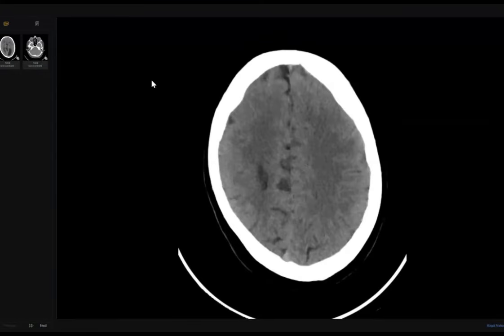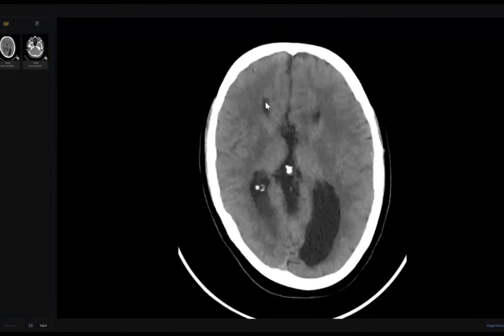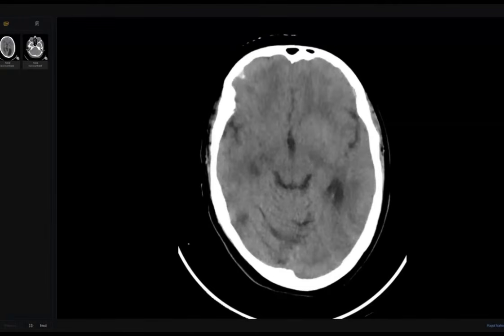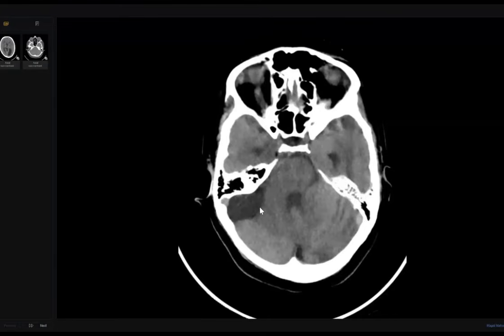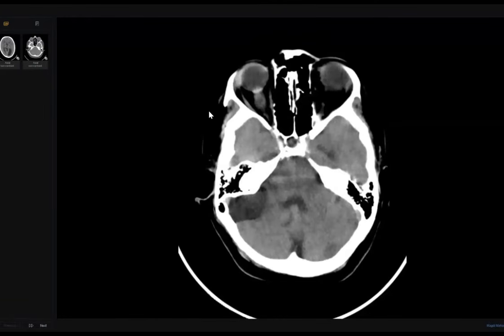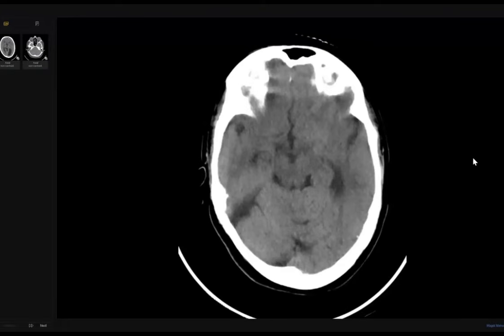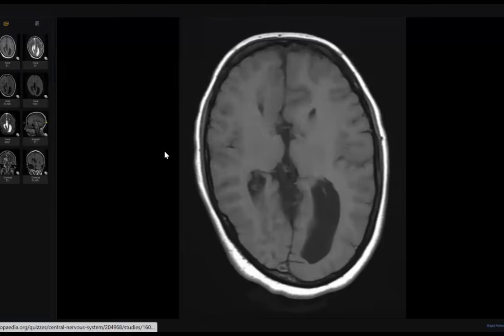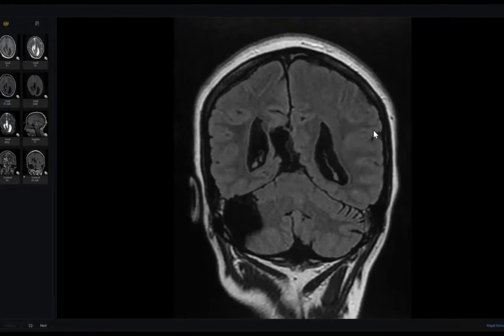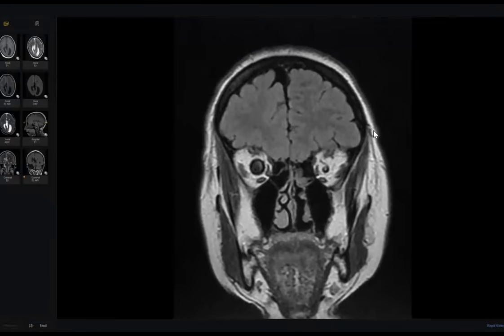At least you picked up most of the findings. What happened here? There are bilateral colpocephaly and bilateral parallel frontal horns, the Viking helmet, or steer horn sign. Okay, and there are many cysts. Here a cyst, and the right parasagittal cyst here, and the orbit. Look here. And one excellent doctor picked up something in the MRI. I think it's not clear here in the CT. Look here, my colleague. What is this? Subependymal nodules. It is almost heterotopia. So, polycongenital anomaly.